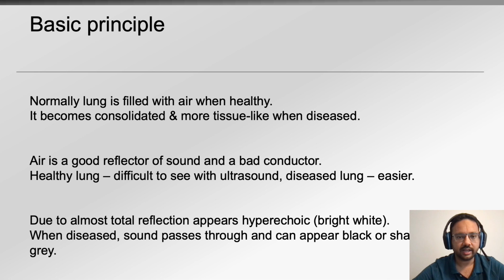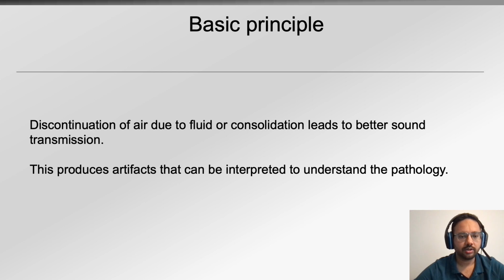If anyone is interested in an explanation of why there are those different shades of gray, please reach out to me, but I think for this lecture it is a little outside our scope. And to conclude the basic principles, whenever there is discontinuation of air in the lungs due to fluid or consolidation, it leads to better transmission. This produces artifacts that we ultimately interpret to diagnose what pathology may be seen in the lung picture.